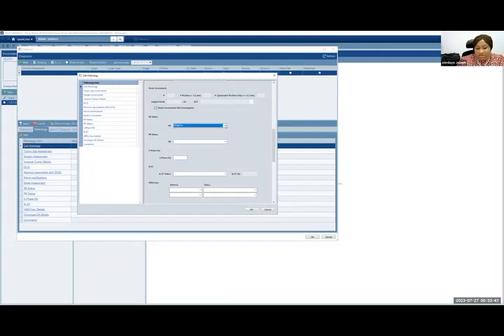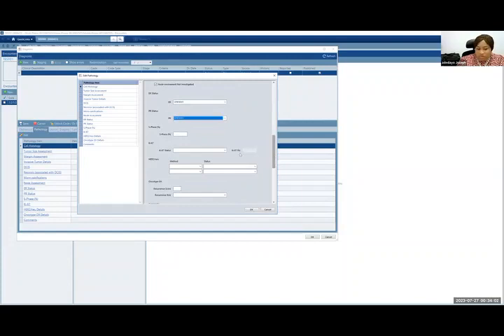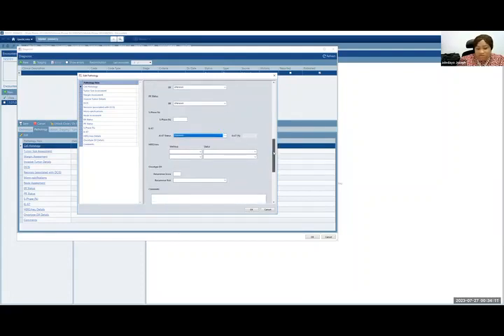Estrogen receptor negative, estrogen receptor positive, or unknown. If it is left blank, then it is possible that this woman is ER positive, but the doctor just didn't fill in the information. And that's why it's important to specify that it is not known or it was not done. This is usually not done, and if it's not done, you just leave it blank as a percentage. KI67 status, if it's not done, you put it as unknown.